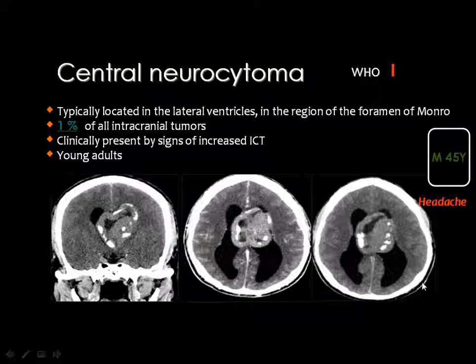But look at this case. This is not a young adult, and he is complaining of headache, and you see a tumor inside the lateral ventricle.